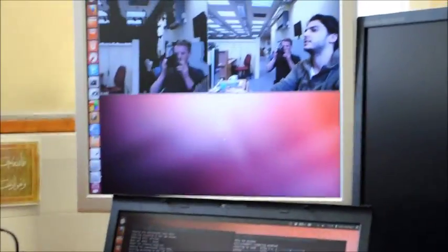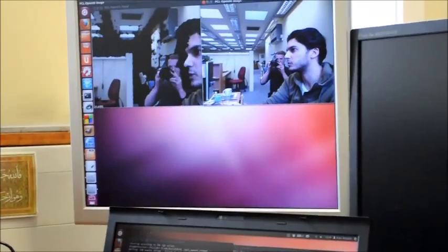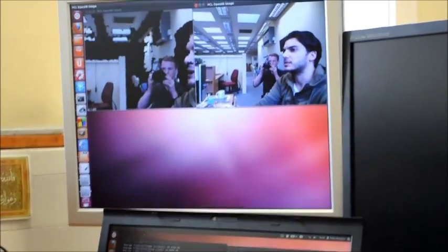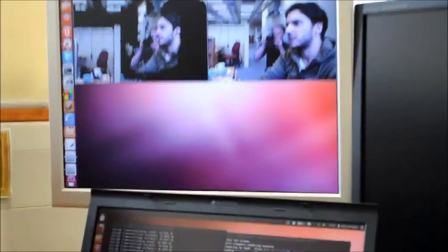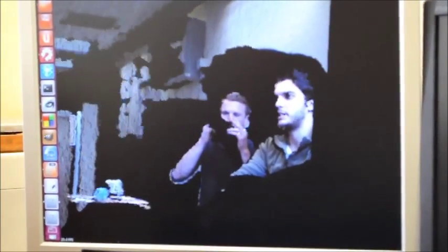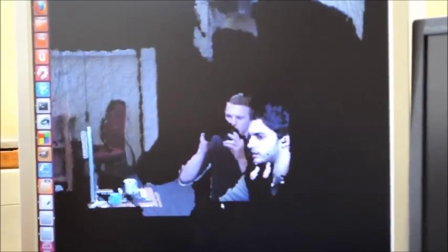On the right side, this is footage from a normal camera, and it has X and Y dimensions. However, a 3D camera can detect things in 3 dimensions. So let me zoom that in. As you see, that's me and Ollie taking the video, and we can see from sort of all directions. So the Kinect gives a real good enhancement to the type of images we get.